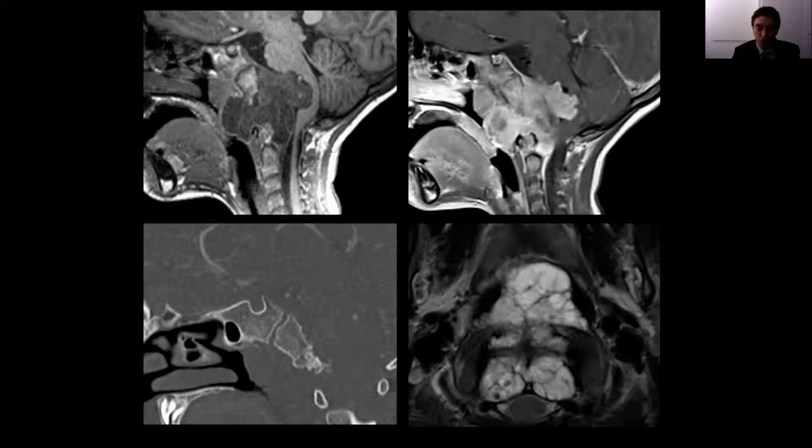on T2. And this is one of the important characteristics of chordoma, that on the MR images, they will be fairly well circumscribed, and on the T2 weighted images, they're going to be very bright because of the contents of mucin and necrosis with dark intervening septations.